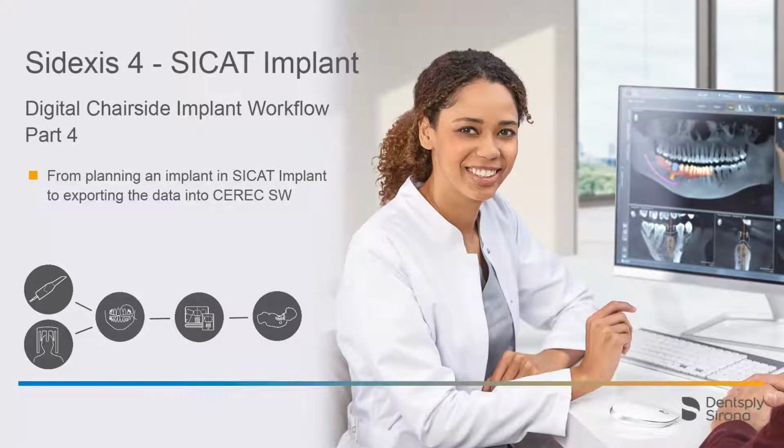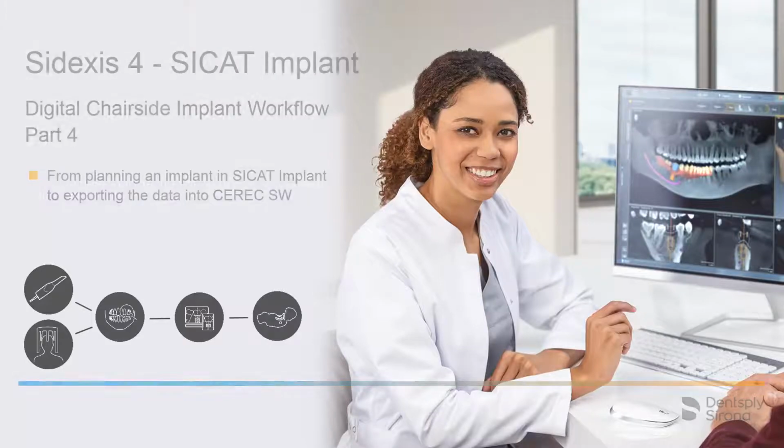Welcome to this video tutorial on the topic of digital chairside implant workflow. This video is part 4 of a tutorial series. In this video, we focus on planning an implant in SICAT Implant to exporting the data for importing them into the CEREC software and the associated surgical guide planning for a CEREC Guide 3.